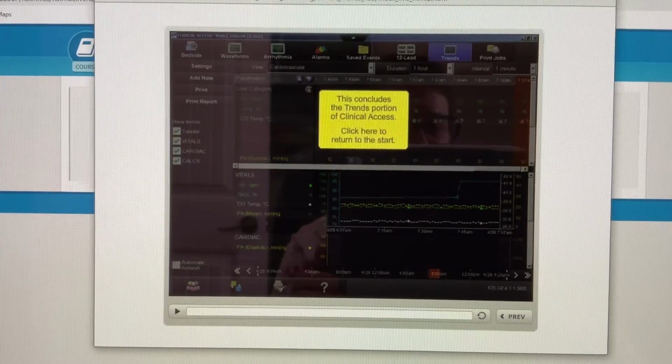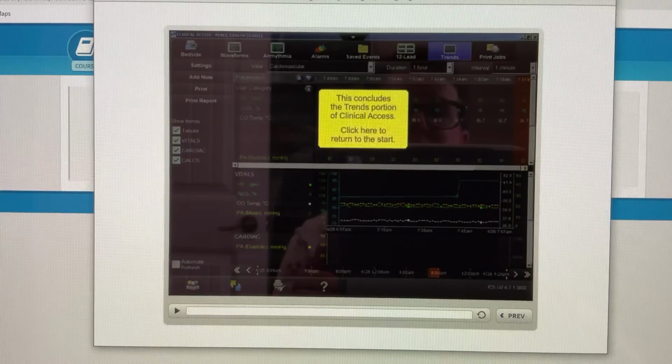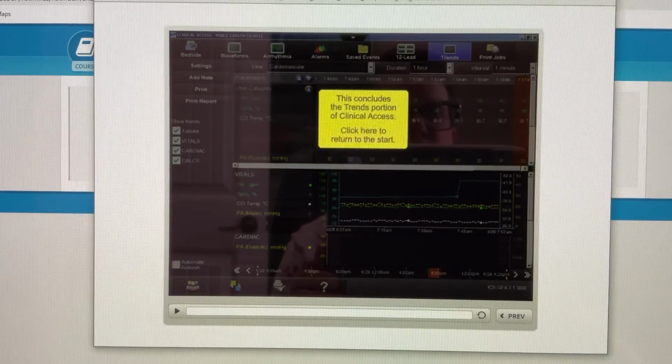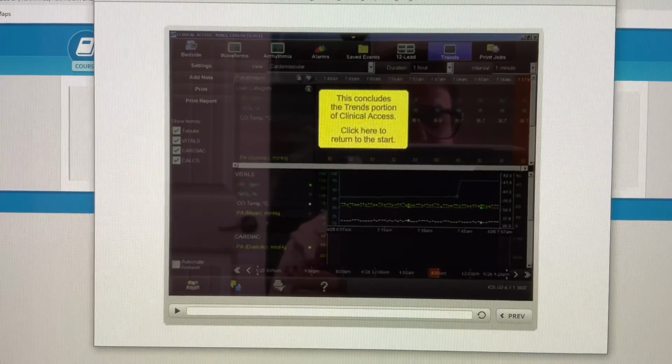And then at the end of your shift, you do not have to do a measurement, but you do have to click the Analyze button. And so I would likely do this just prior to putting my morning report together. And I would want to analyze the patients that I had cared for in case I had missed an arrhythmia alarm. So instead of scrolling through and looking for atrial fib, if your patient has had a change in rhythm, then that will be documented.